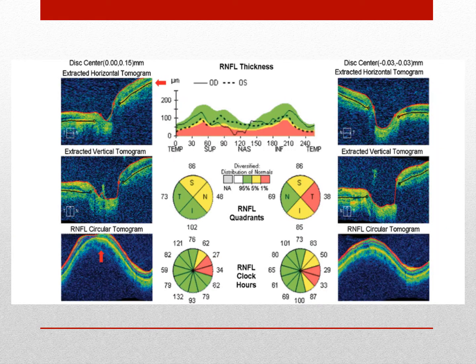So here, this is just another OCT scan separate from the one that I showed you before. I just want to show you an example of that decentration of the z-axis where you have truncation of the image. So here your structure is cut off, right? And you'll see that's mostly with patients with head tilts or even large cupping and other diseases as well, right? Where you cannot fit the whole structure because of extremely different heights of structure. We can't fit all that into a single B-scan, right? Sometimes it's very difficult. So you really need to see why you're seeing a red, where is that coming from, and reason it out.